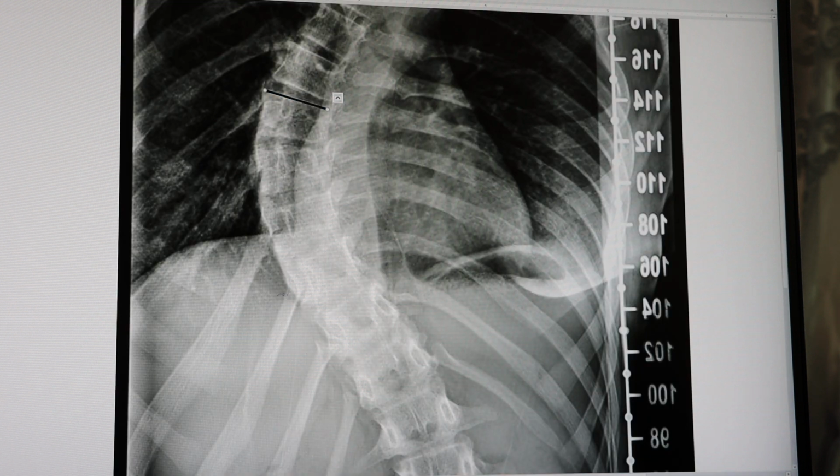And let's play with the colors. And again, these lines are drawn at the edges of the vertebral body. And yeah, I can actually see that there is something in the dimension of this vertebra. So if I measure the distance between the edges at the right side, the edges of the vertebra at the right side is not going to be the same as that on the left side. At the left side, it's smaller.